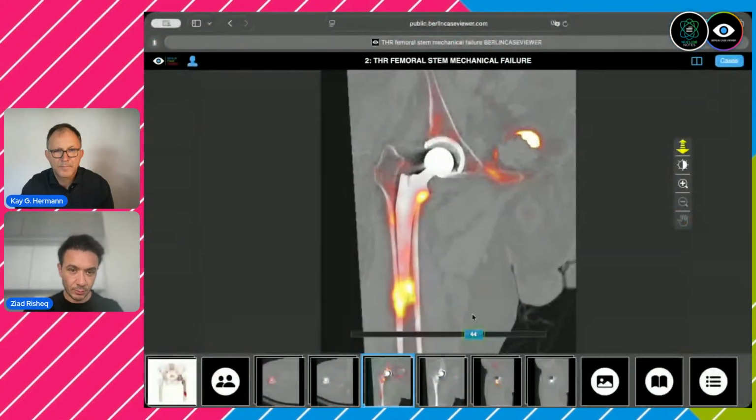This was really significant. So one way to do it, as I said, is to draw a horizontal line over here, and you copy that onto the most superior part of the shoulder stem, and you measure the distance. If it's more than 4 to 5, this is sensitive, it's not specific, you can suspect a migration.